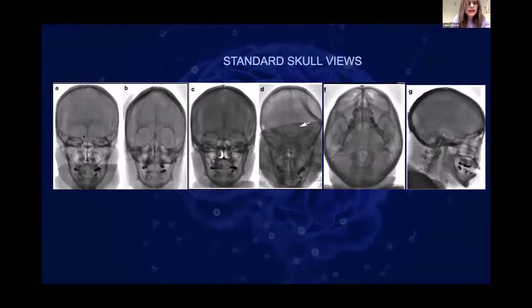This is the conventional AP view for the internal carotid artery. In this, you can see that the petrous ridges are at the superior orbital margin. And this is another view in which the petrous is at the inferior orbital margin. You can see both orbits, so these are the AP projections. One clue which is not written anywhere in the book for youngsters is that they can evaluate by looking at the orbits. When we see two orbits in the frontal projection, it means this is the AP view.